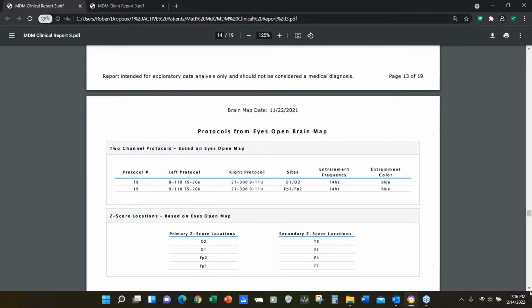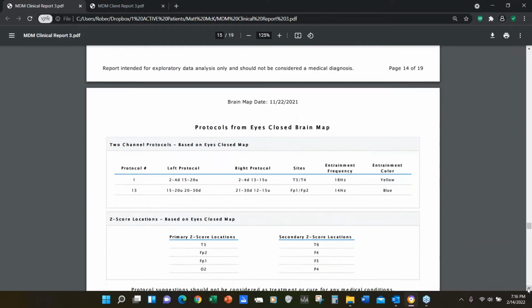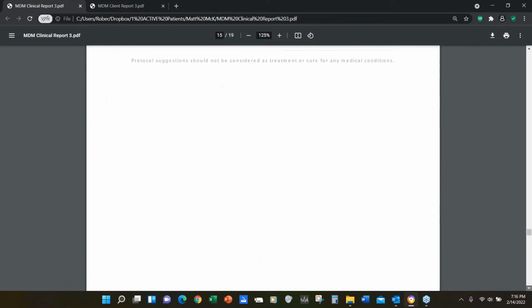And then your z-scores. Then you come down and you have the supplements that are recommended based on the map, and it summarizes your patient's overall physiology report. And then this newer edition, which came out within the past year or 2, is functional deviance by location. It really summarizes the map and the key areas of the map and what some of the indicators are from a diagnostic or symptom standpoint.